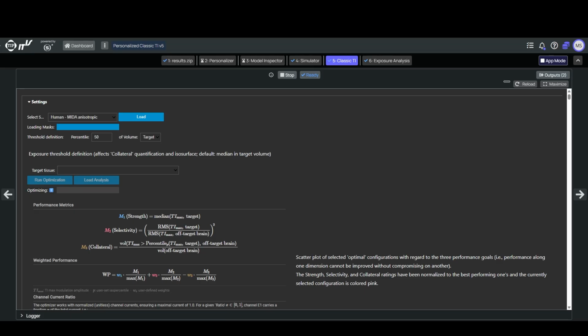TIP version 5 replaces that limited service with a full Sim4Life workbench. Modeling, simulation, and analysis. All three modes. The subject model is forwarded. Let's have a look at that in action. In the prior step, the TI analysis, you select your subject from the drop-down and click Load.